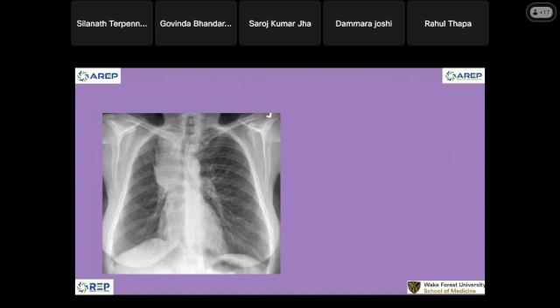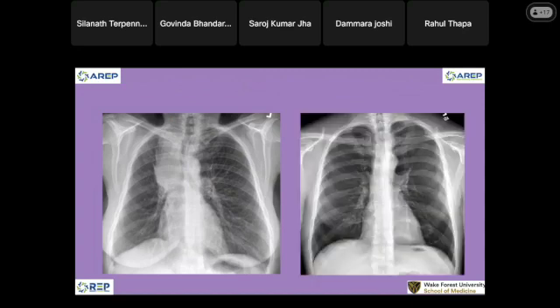Thyroid cancer does not have to be a big mass. This one is easy. This can be smaller than this, but produce a lot of symptoms and abnormal thyroid function tests. So the obvious thing is when you see tracheal deviation, don't forget to think about the thyroid mass as well.